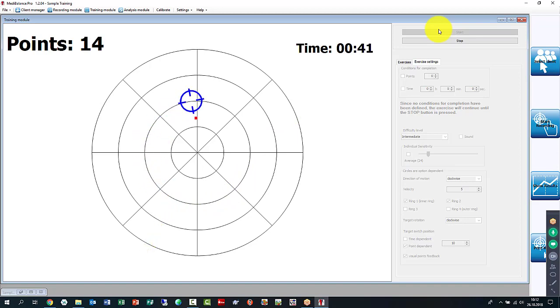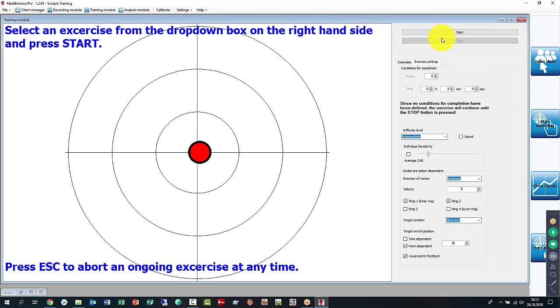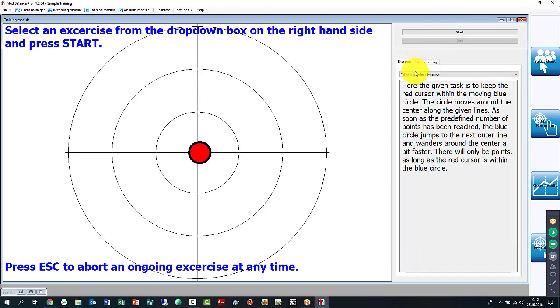So it's a lot harder to catch the points here and to even get more than 1 point consecutively. Once I've done my 20 points here, it will go back to the initial side and it will be easier. So I'm trying to demonstrate that. 1 more point, and there we go. And now I can relax a little bit again and do the same thing over in here and so forth. And you can see 20 points in 1 minute, which is not too bad. And we're done with this exercise.